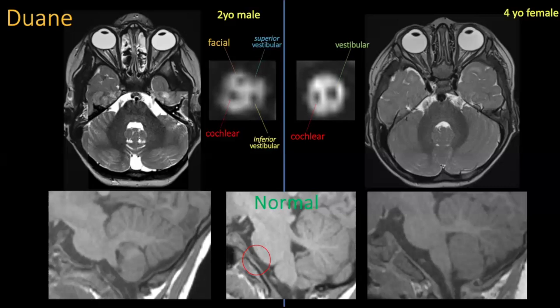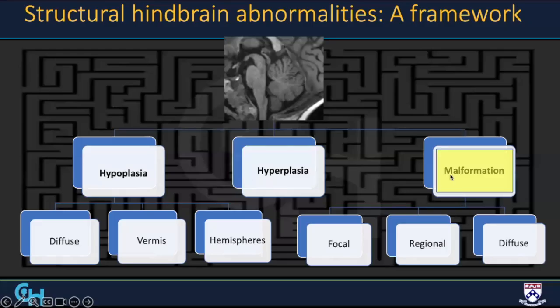in union together. All right, this is a case of Mobius syndrome, and Mobius syndrome can be genetic, can be sporadic, or it can be acquired from a prior insult. But both of these are considered to be due to hypoplasia secondary to dorsoventral patterning defects or misspecification of germinal zones. Okay, on to malformations.